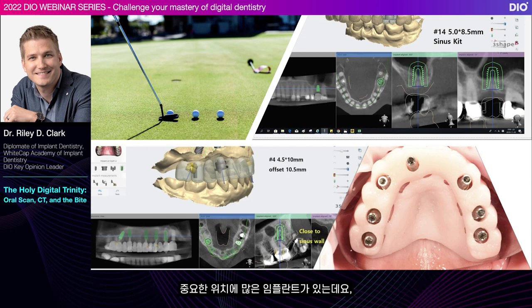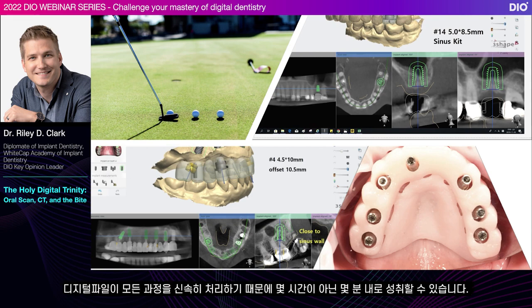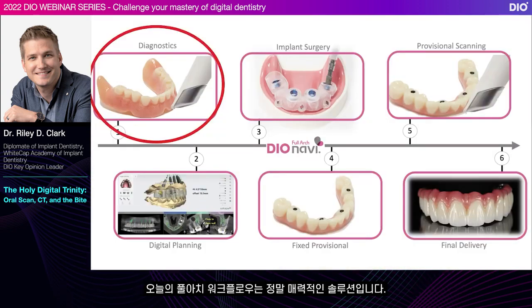We have multiple implants in key positions. They are all parallel to each other, and they fit beautifully relative to a prosthetic. That picture on the bottom right is why the data is so important and how powerful it is, because we can accomplish things like this in a matter of minutes instead of hours, because the digital files allow us to expedite this entire process.